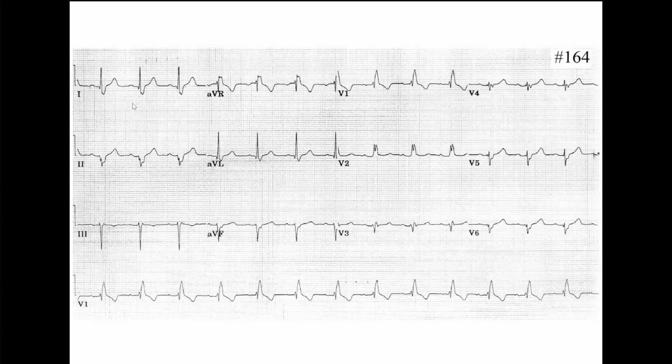About the axis, I forgot to say. It's left axis deviation because we have positive lead 1, negative AVF. So it's left axis deviation. This is the pathological left axis deviation. Yes. Okay, because lead number 2 is negative. Lead number 2 is negative. Okay, yes, go on.